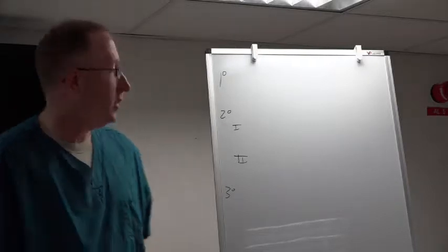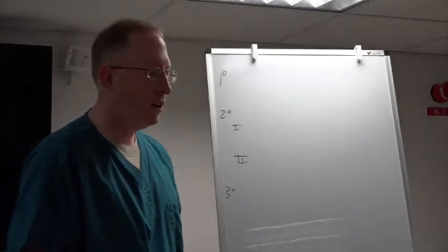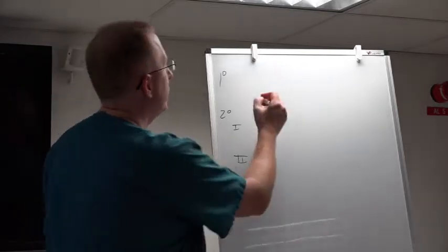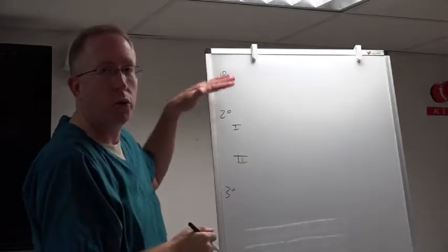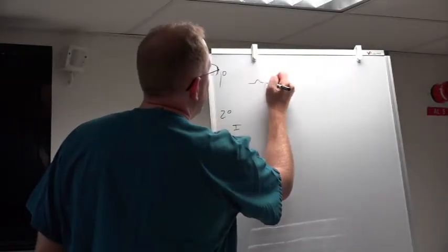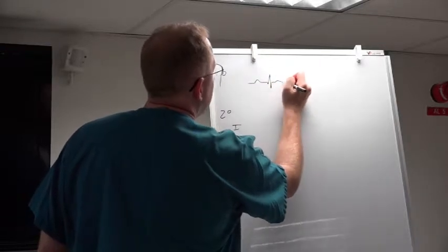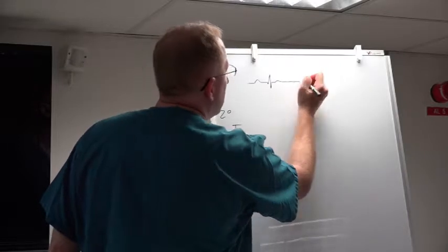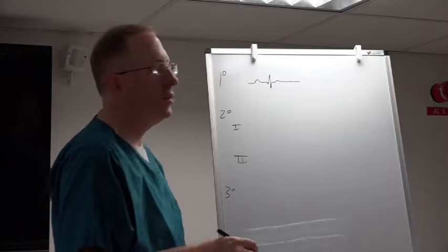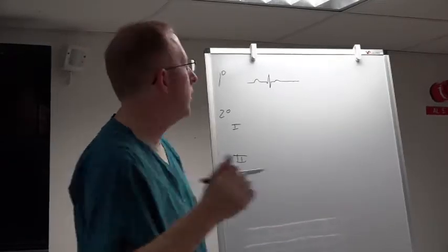So, first degree heart block, clinically insignificant most of the time, and it's just kind of a gee whiz thing. Of course this is all in order of severity too, right? So your first degree block, basically you have your P wave and then your QRS, and then T wave. And it's not necessarily going to be bradycardia, could be, but it's not necessarily bradycardia. The important thing is the relationship of the P wave to the QRS complex.